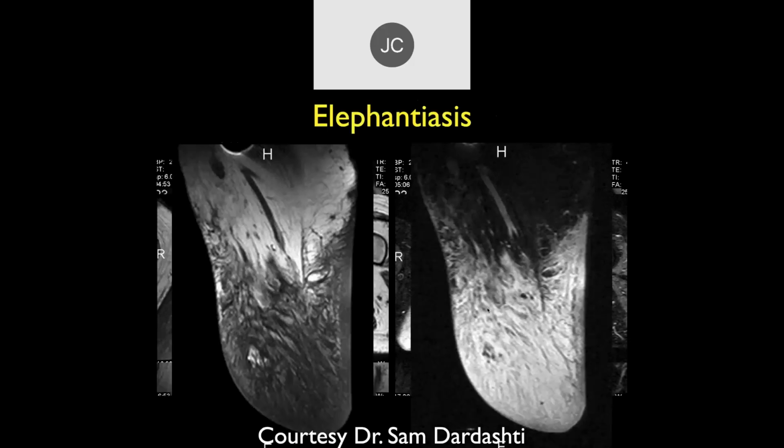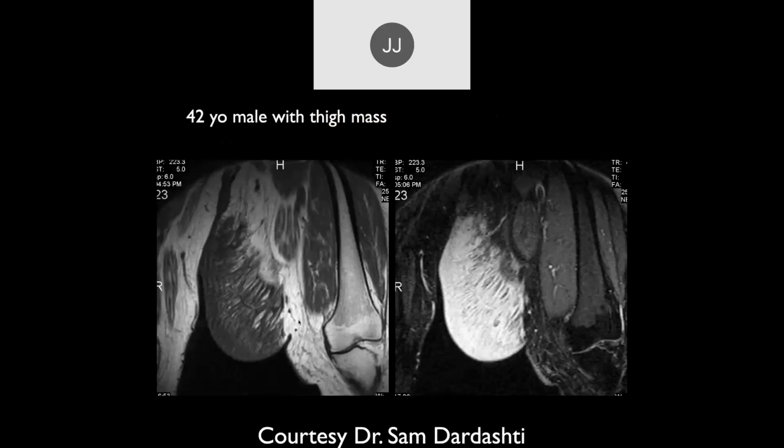Trichomonas, or isn't it trichomonas? Is that what it is? Well, I'm blanking. Filarial. Filariasis. It obstructs the lymphatic system, and you get these large areas of lymphedema. That's why it looks like this. It's actually obstruction of the lymphatic system, and they build up with fluid within the lymph. It occurs over long periods of time, causing expansion of the soft tissues.